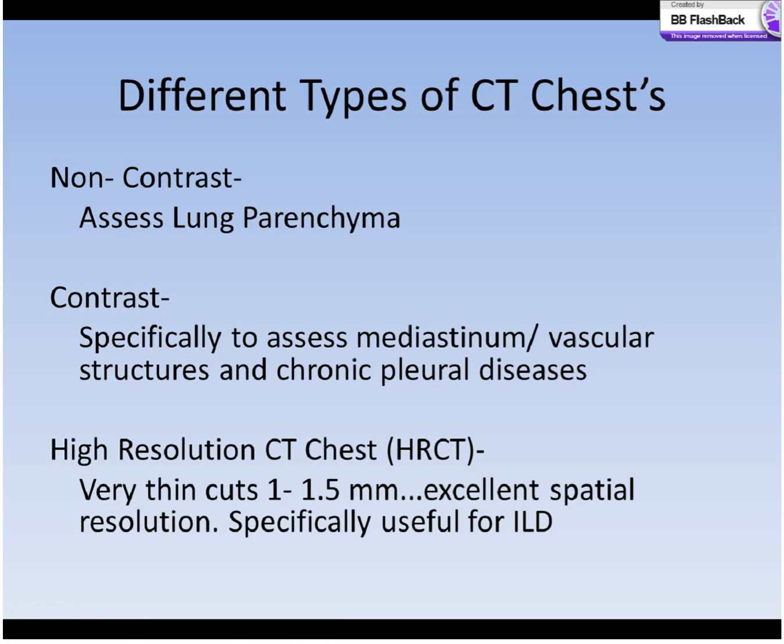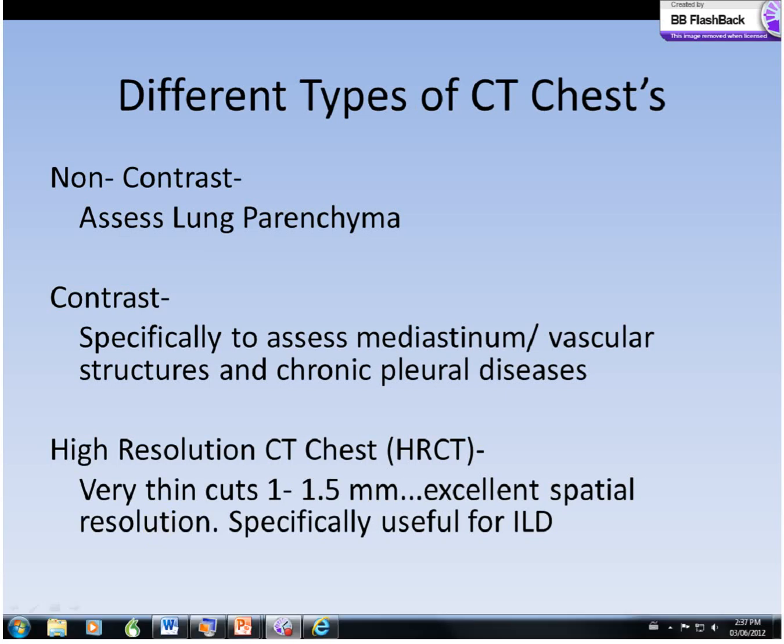On that note, there are different types of CT chests. High-resolution CT chests are extremely useful, specifically for interstitial lung disease. They provide very thin cuts, and because of that, provide spatial resolution, so the parenchyma, the lung tissue, is visualized quite well.